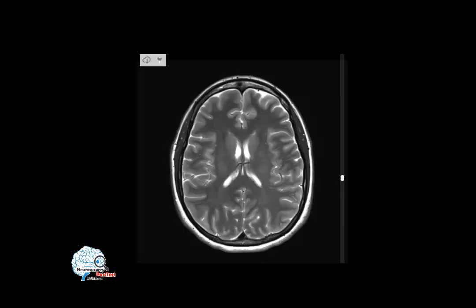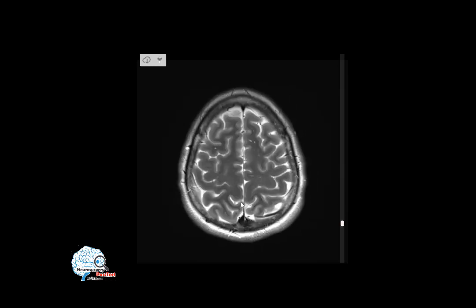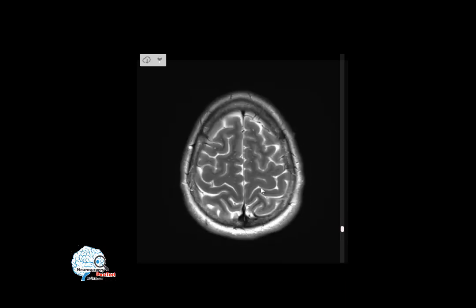If we go to the MRI, it will be a little bit easier to identify the central sulcus. So this is the mustache marginal sulcus that we talked about, and just anterior to it, you will find the central sulcus. This is the motor area, this is the sensory area in the parietal lobe.